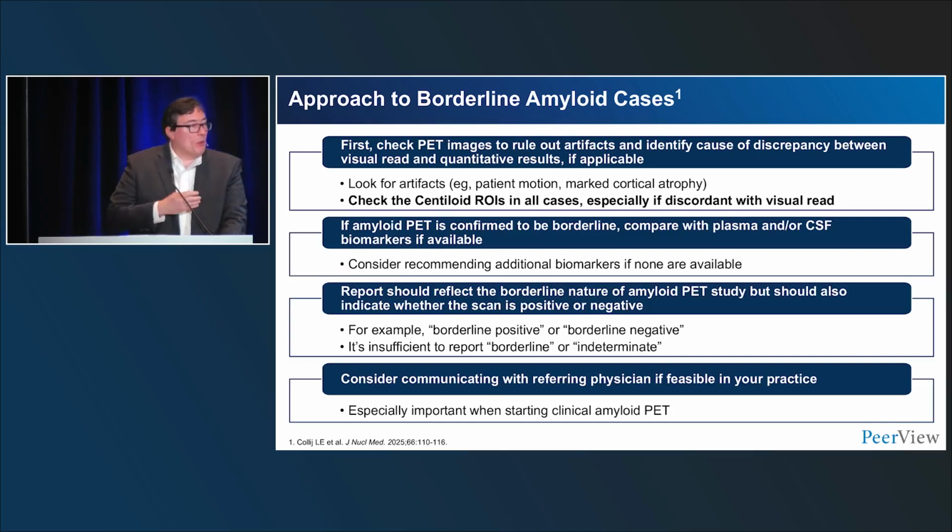I like to use the term borderline, but only in the context of positive or negative, meaning my final report is not borderline. I assign it as positive or negative. If it's truly, truly uninterpretable, you can say that, but give a reason. That should be very rare.